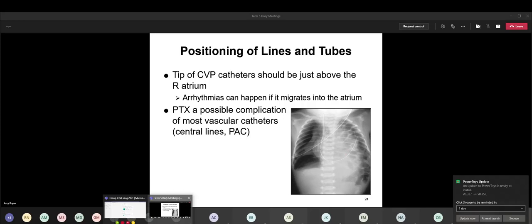So all of this right here that you're seeing, all the dark, kind of looks like if you took a sock and you put a bunch of oranges in the sock. That is intestines. So his intestines have moved from, of course, the abdomen area through an opening in the diaphragm and made their way into the thoracic space.